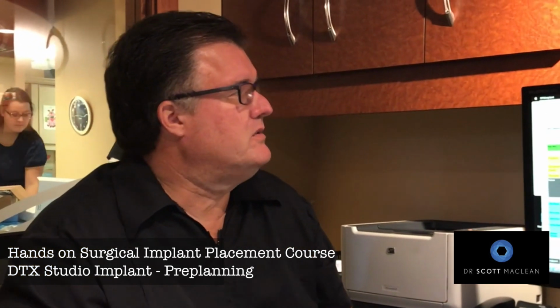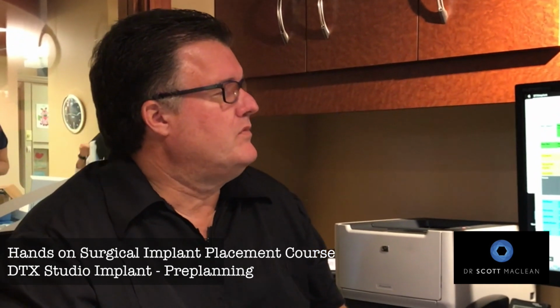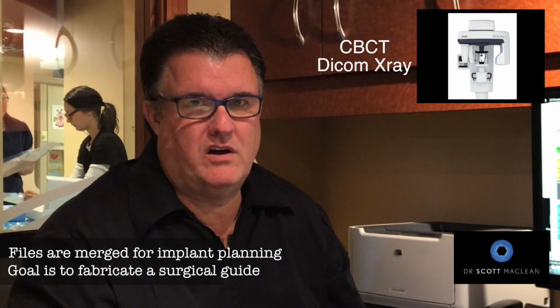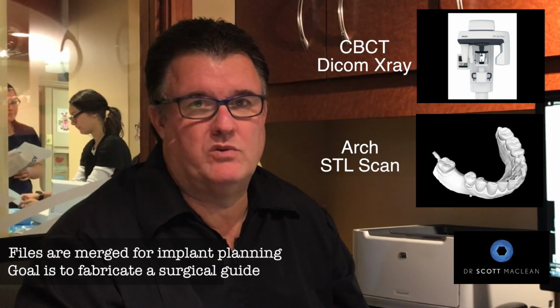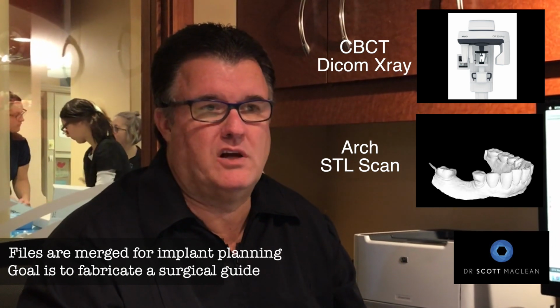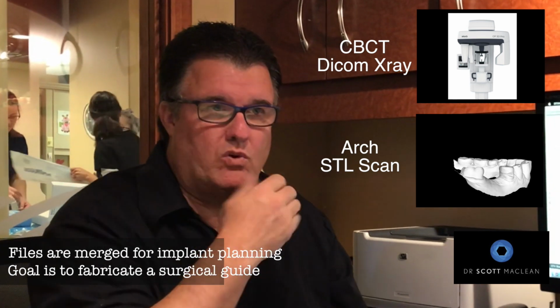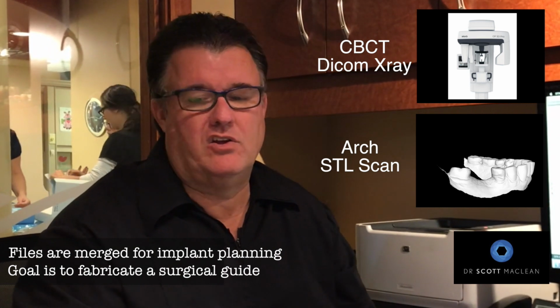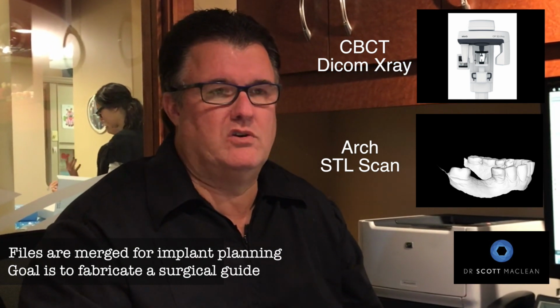If we open this, I'm going into a planning session with DTX. DTX is going to allow us to integrate an X-ray, which is a DICOM file, and also a file called an STL file. An STL comes from a scan of the patient intraorally with an intraoral scanner, or with a benchtop scanner scanning your model. When you do those two things, you can put those together and do the planning.